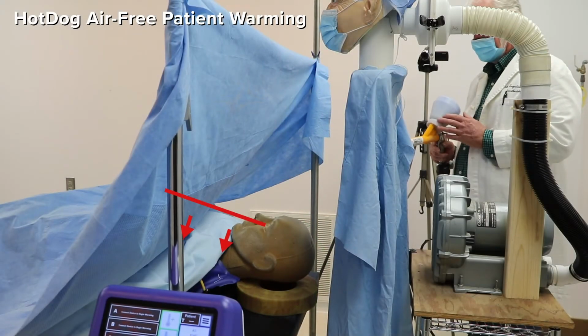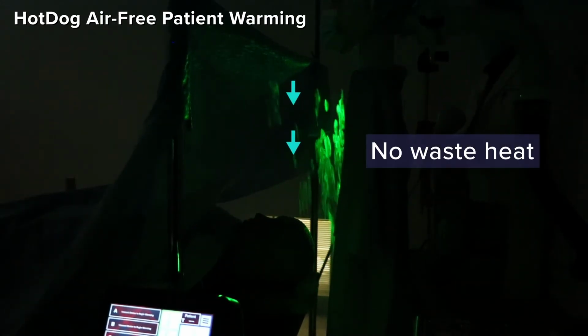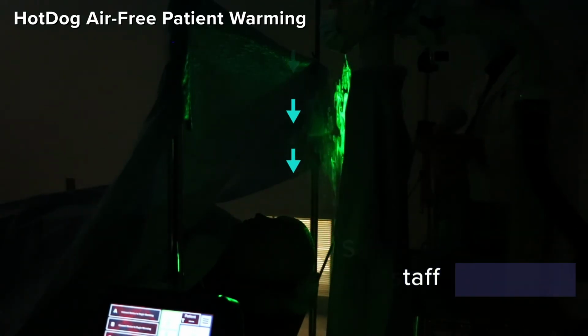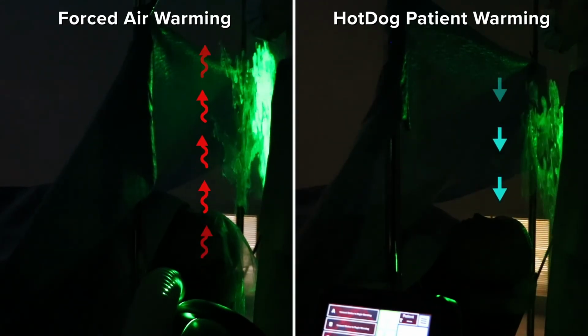In contrast, air-free warming systems do not generate significant waste heat, eliminating rising currents of warm air that vectorize harmful particles. Air-free warming is a safer way to manage normothermia for the patient, and, as demonstrated in this experiment, it's significantly safer for the staff as well.